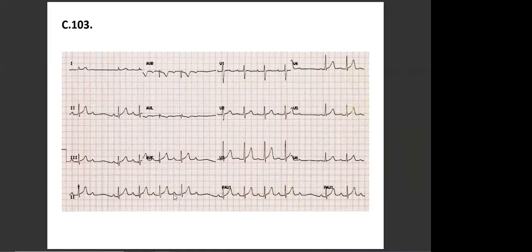Because the PR interval gets longer. Yeah, or using the RR interval? No, that's harder for me. I suggest that when you have this kind of situation, look at the last conducted PR and compare it to the first conducted PR. Don't look at whether the PR is getting longer. Last one, first one, period.